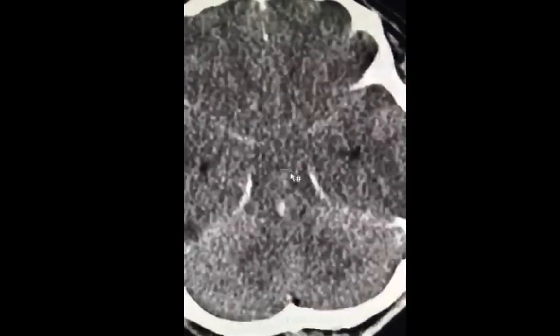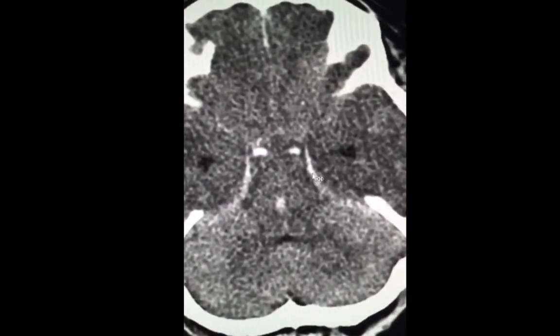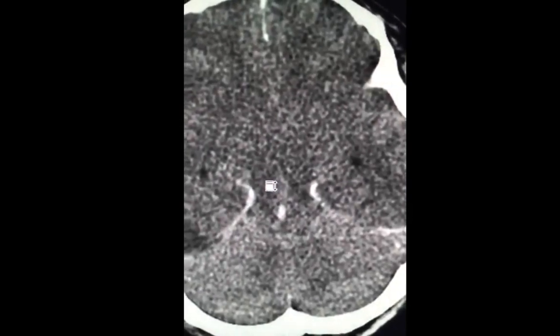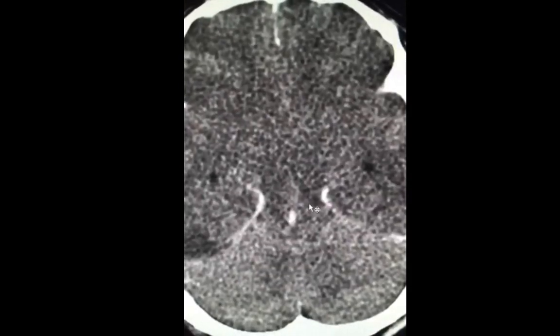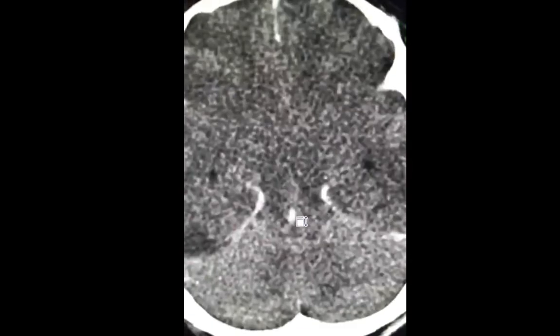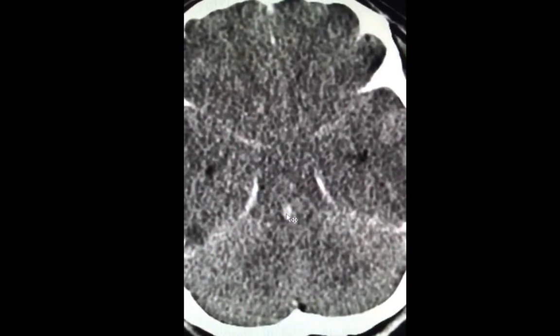In a normal patient, you should see a CSF black density surrounding the brainstem. Here you don't see that, and this is a result of herniation. This type of herniation is called descending transtentorial herniation. Again, I will separate another session for talking about herniations. However, this focus here is related to what we're talking about.